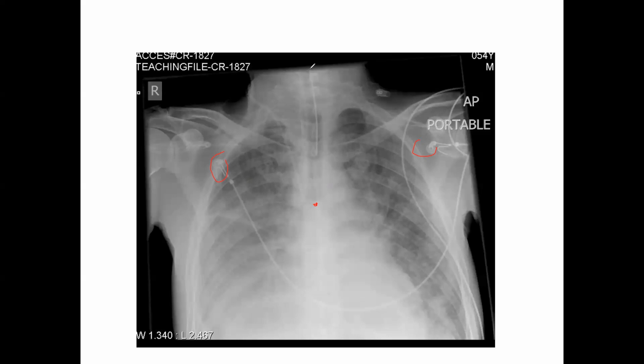But if you'll notice this heavy white line that you see right here, and I'll try to trace it, this heavy white line, that's your radiopaque line on your endotracheal tube. So this patient has an endotracheal tube. You can also see that you've got your pilot tube or pilot balloon right here. You can see these little circles, that's a spring-loaded valve. So you'd actually insert your syringe here and inflate the cuff, because this endotracheal tube has a cuff on the end of it, and that cuff is going to be inflated with air to seal off the trachea so that the air is only moving in and out of the lungs by way of the endotracheal tube that you've got placed in there.